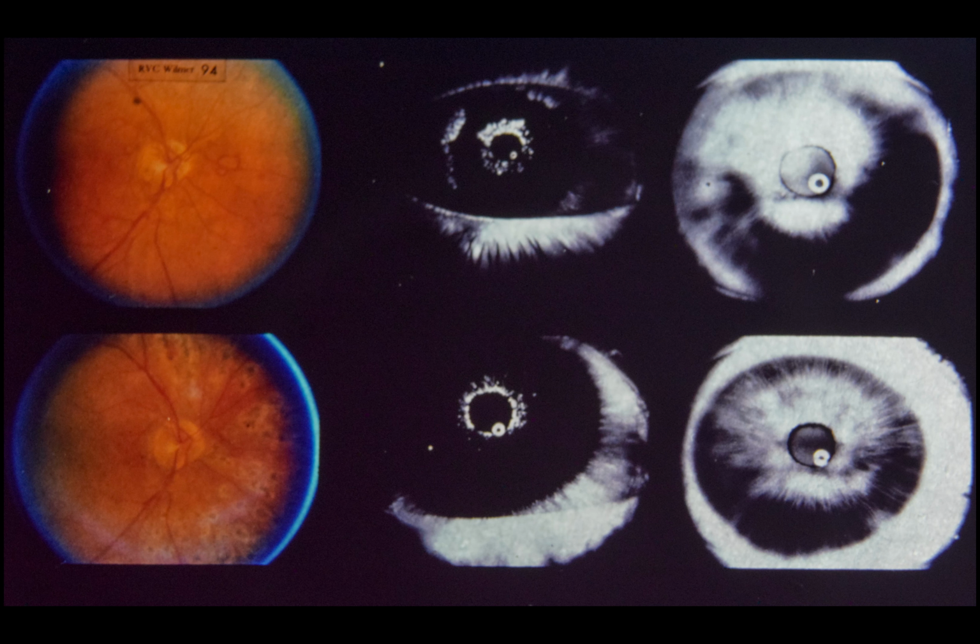You have now completed a preliminary course on fluorescein angiography and retinal vascular disorders. The next 6 slides will test your progress thus far. A brief clinical history will be given for each slide. Then you will be asked several questions. Please write down your answers to the questions. After slide 100, return to slide 95 for a discussion of the 6 cases. If you missed any, you may wish to refer to the appropriate section in the course.